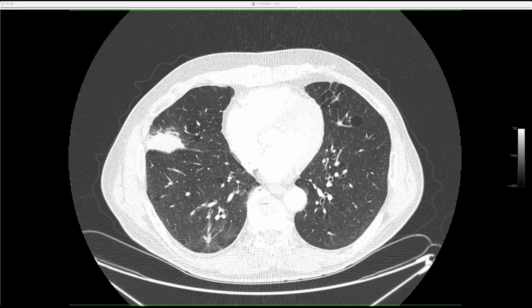So Howard, could I ask you about your impression of the cysts and the bases here? Would you invoke some light chain disease in the setting of Sjogren's and some amyloid, or are you satisfied with just LIP for the basal cysts in Jeff's case?